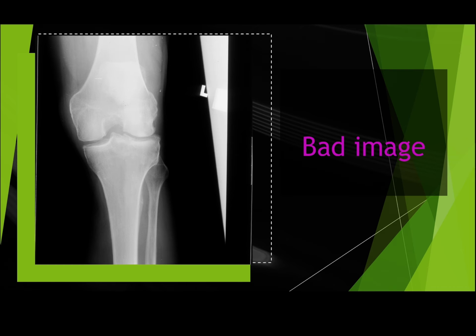Because it looks like there's some rotation in the leg. Also, there's not a very clear view of that fossa. It could be more open, I believe. Also, maybe a little slightly too open on the collimation. It should be a little tighter.